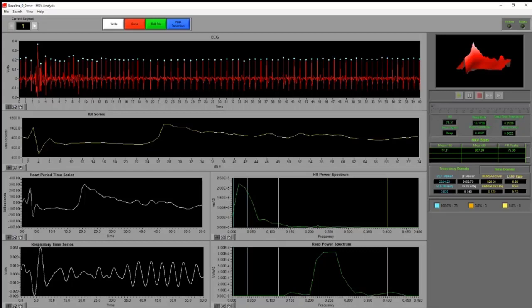And lastly, we do have some new features in the 3.2 application that I'll highlight just briefly. This is one of them, and it certainly is a big time-saving feature. What it is, editing statistics. So we have a couple of rules. There's about 3 or 4 that I'm going to give you today that are really scientifically founded suggestions on how to edit this ECG data. If there are artifacts or if there is ectopic abnormal physiology, how do we edit that data?